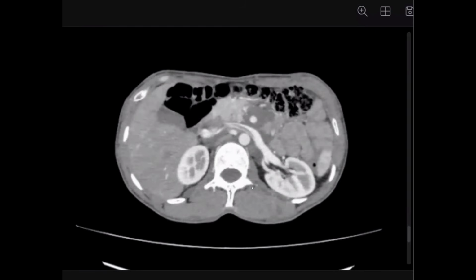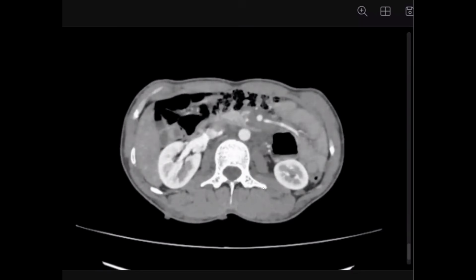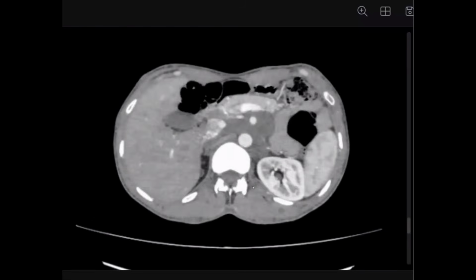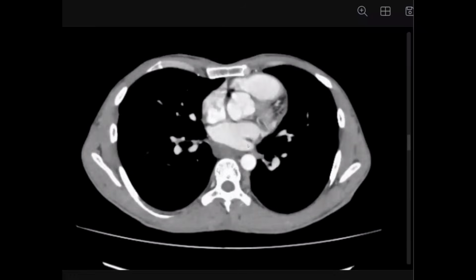Okay, can you check the skin, please? You will find multiple skin nodules. In your exam, before asking the clinician, check the skin itself. This is the key in this case. Multiple skin nodules with retroperitoneal masses, extensive masses like this one.